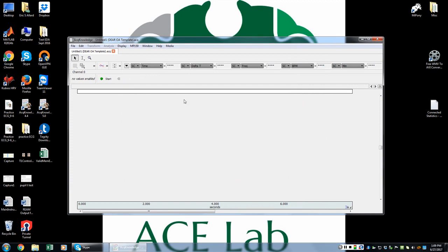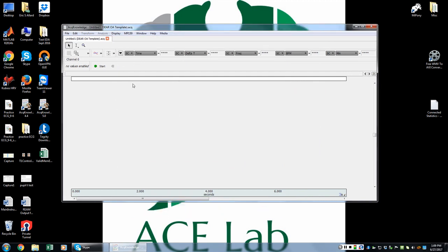Okay, so now what you see here is the actual template. You don't see anything being recorded right now because we haven't actually started the recording. So this is good because this is the default telling you, all right, now that you have this open and ready to go, maybe you haven't hooked up your participant yet. Okay, so you want to hook up your participant, then once everything is on, you know that your transmitter is on, the leads are on, etc., you're going to go ahead and then click Start.